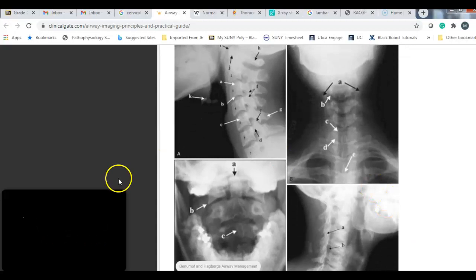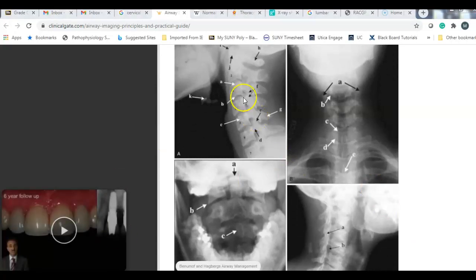You would do a lateral view. So if you can imagine, this is the jaw. This is the cervical vertebra. Those are the body of the vertebra. These are the spinous processes back here. So the patient's facing this way. So that'd be a lateral view.